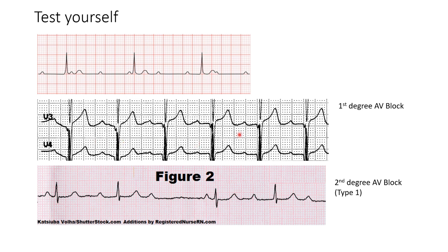But since that's the only pathology we're seeing, a prolonged PQ interval, we can say that this is an AV block of the first degree.